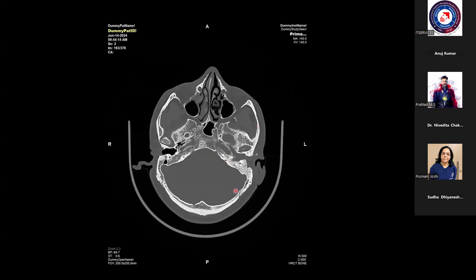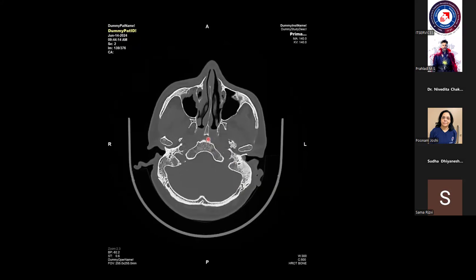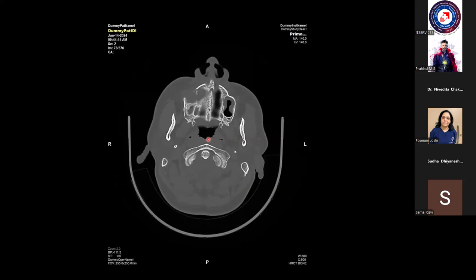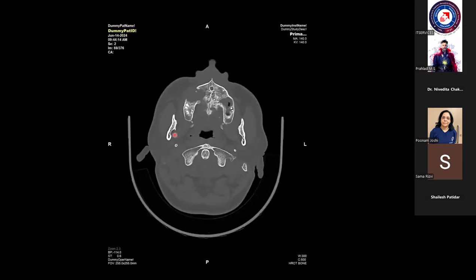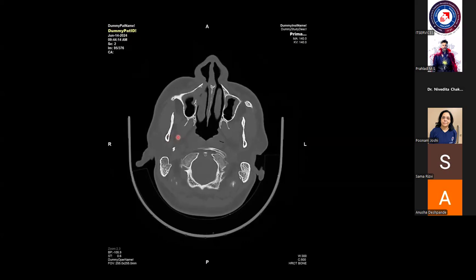Nivedita, can you please show how to trace the pathway of perineural spread for V2, V3 on MRI? Now V2, you know, the foramen rotundum. V3, I think I should be having the section. So this is the mandibular foramen, right? You have to just follow this. Since I have not included the soft tissue part over here, but you just have to trace this. Maybe that can be another class, tracing the nerves.